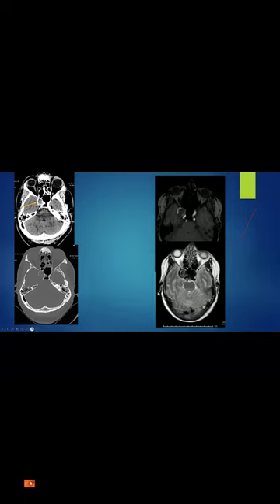But again, our eyes have a tendency to ignore things that are very variable. This area is very variable. Some people have a very big sphenoid sinus, and some are occluded because of a mucocele or something, but mucoceles usually don't have this very nice rim of calcification. Just be careful: a calcified aneurysm in this area can be mixed up with something else.